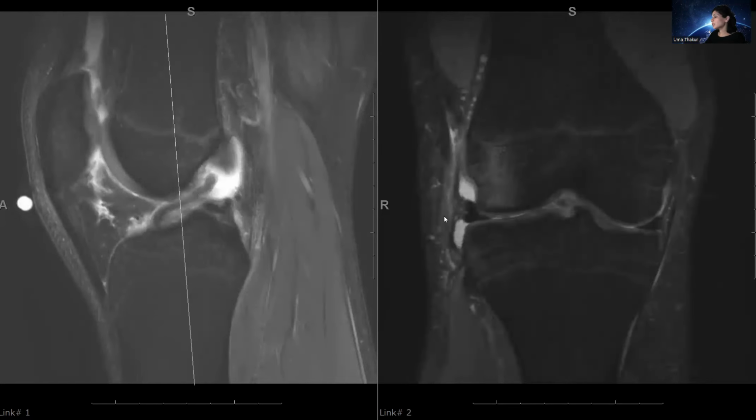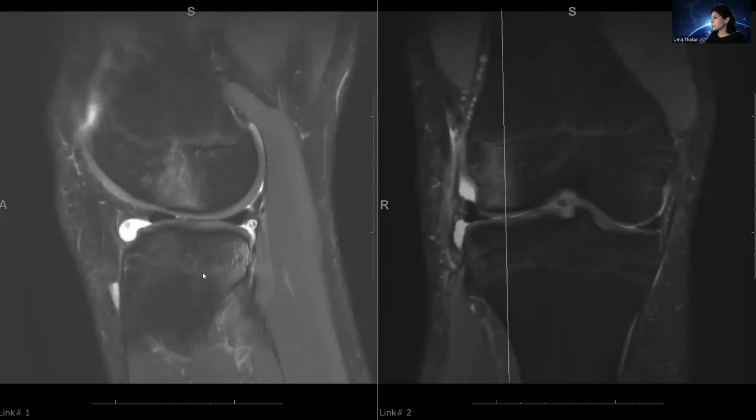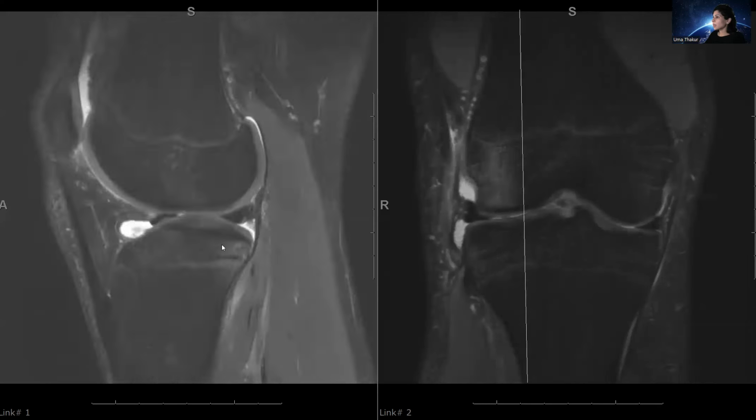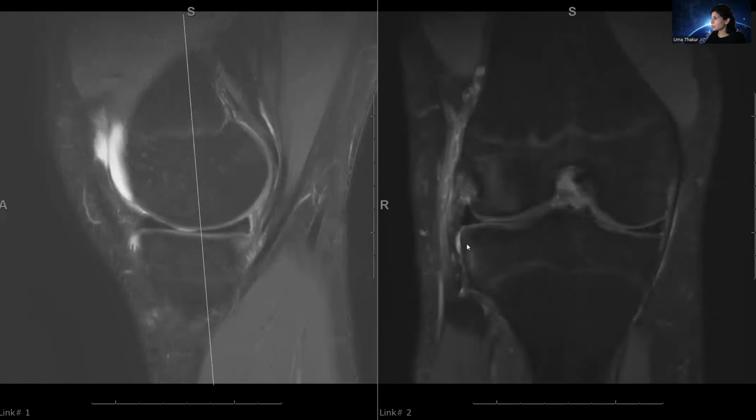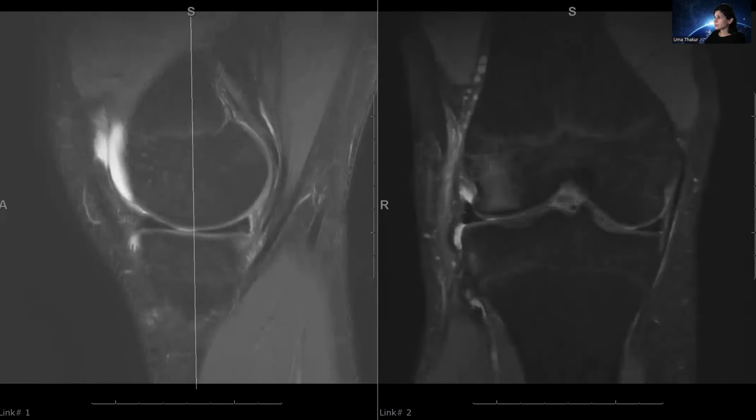You can also appreciate the bone contusions, kissing contusions of the lateral compartment that are classical with pivot shift injury, as well as, in this case I showed you earlier, meniscocapsular separation. So you see that again here with the concomitant posterior medial tibial bone bruise and this small vertical undersurface tear of that posterior horn. Now I'll go to the next case.